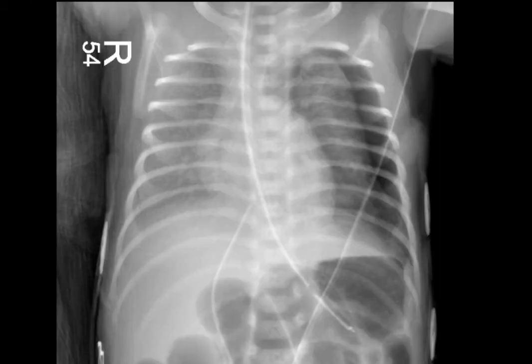This is the right lateral decubitus view on that patient. You can see the sheets folded up against his right chest wall, and you can indeed see that this pneumothorax was a lot bigger than you thought it may have been just on the basis of how much visceral pleura you could see laterally. In other words, don't sit around waiting to see a visceral pleural line, because you're probably going to miss 50 or 60% or more of the pneumothoraces in a supine neonate.